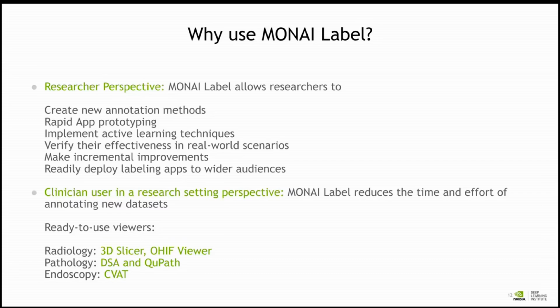The other persona is a clinician working in a research setting. The only thing that they care about is basically reducing the time annotating data sets, right? So you can basically use the viewers that we have implemented for the different applications and start interacting with the MONAI Label server.